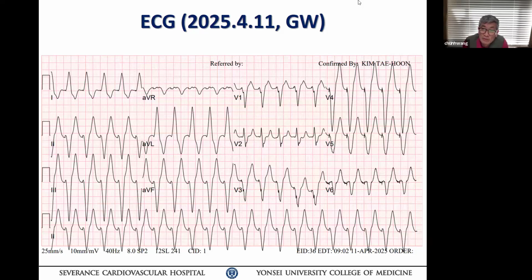So once you pace the ventricle, there is a ventricular refractory period programmed by the pacemaker. So the pacemaker is blind, it can't see anything. What happened? Assuming that is correct, that's a real thing, it favors supraventricular tachycardia, atrial flutter or something going on, and the pacemaker behaving at upper rate. That would be the argument here. Okay?